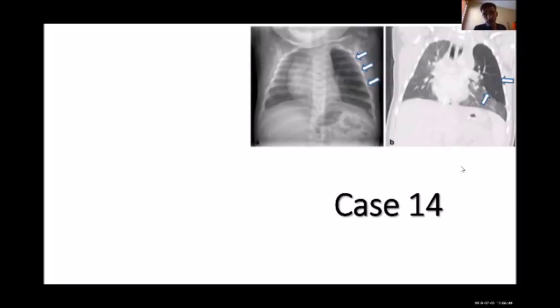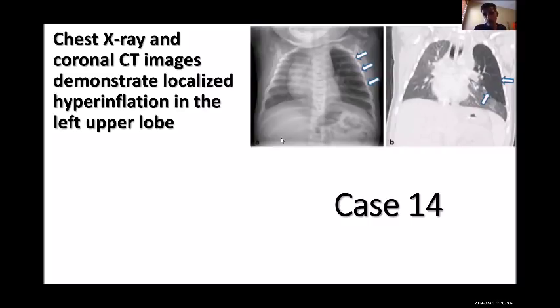Type 4 is the cystic adenomatoid, which is very rare with a very poor prognosis because it has a malignancy tendency. But here you can see the lung is pushed, the heart is pushed, and it's full of air. So I would say it's emphysema. If I say emphysema, I would get 50% of the mark, because I think it's a congenital emphysema.